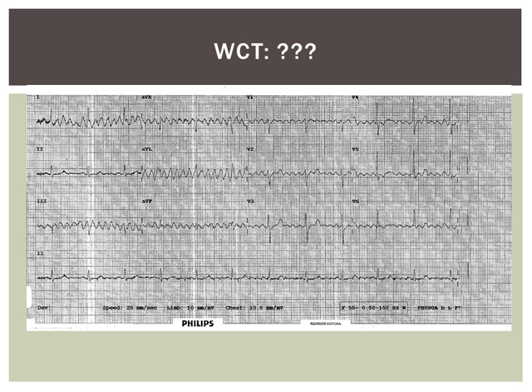What about this one? Some of these ECGs get called VT, and the commonest reason is because shiver artifact is up on a monitor, not on a 12 lead. So if you have a look at leads 1 and aVL, you get a significant shiver artifact. Sometimes you can have auto gain settings on the ECG which actually turn up all of the signals and make it look exactly like VT. So if you're looking at a rhythm strip and you see what you think is VT, be sure you confirm it by holding the patient's pulse.